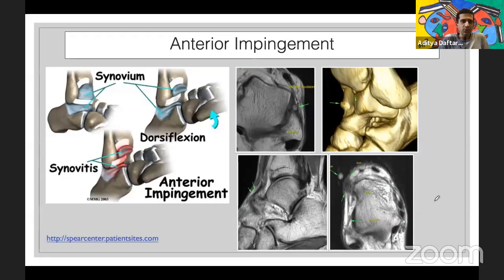So if you have a patient with anterior instability, you can have gradual movement. Micromotion leads to the formation of bony spurs or osseous remodeling.